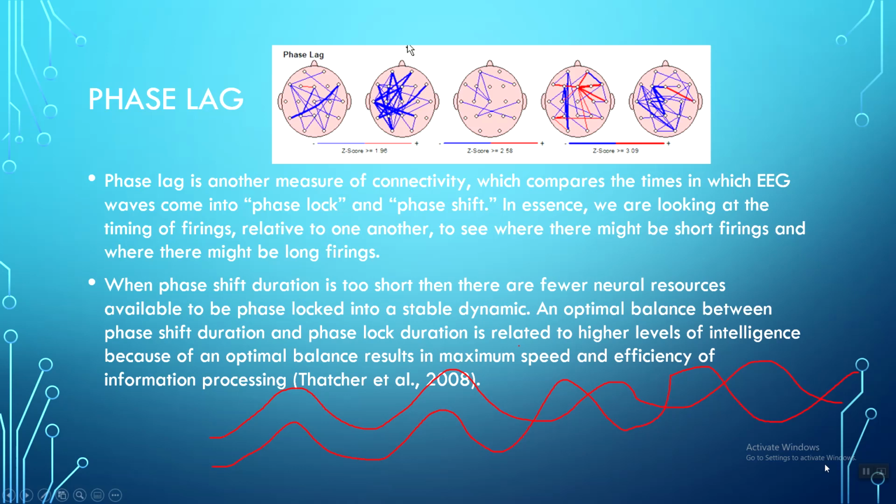So I'm going to pause here for a second. So for this last piece, when the voltage of the EEG is low, so the beta is blue, or the theta is blue, or the alpha is blue, or whatever, coherences and phase metrics are not significant. Because with microvolt squared, we're looking at something called 1 over f, and when essentially you're comparing teeny weeny and teeny weeny, how they cohere is irrelevant, right? It's not an important metric. Coherence loses its power in terms of how important it is when the voltage is low in that frequency.